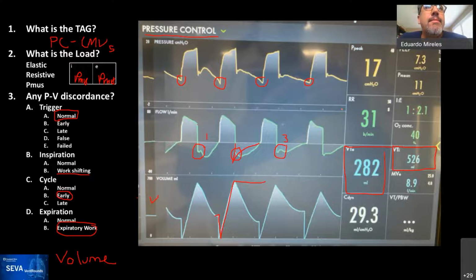Are not leaks more prominent during the inspiratory phase when the circuit is pressurized? Yes. So that's a great point, Rob. So Rob, the other Rob Walsh, brings a point regarding the timing of the leak. There are leaks that occur throughout the respiratory cycle, and there are leaks that occur only during the inspiratory phase of the cycle. And I'll give you a couple of examples of these two types of phenomenon.